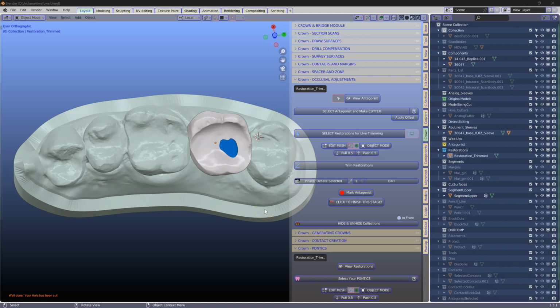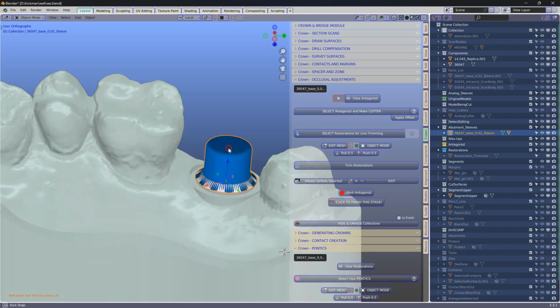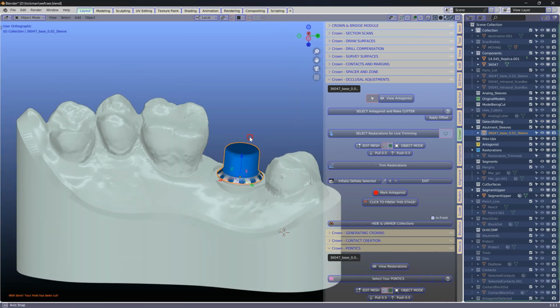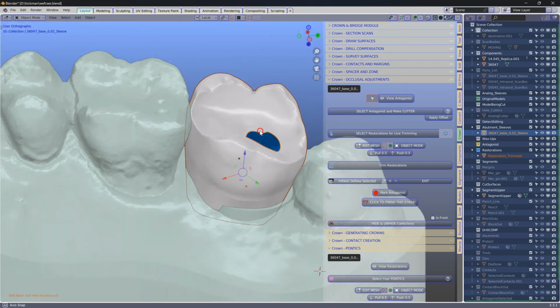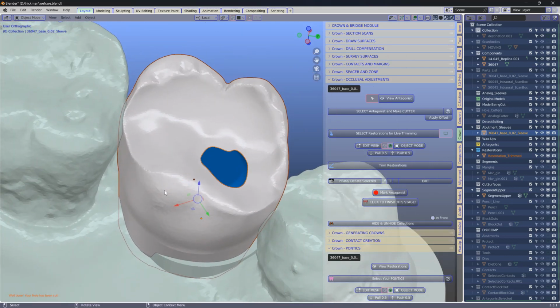Hey guys, clearly we've got a problem over here. Not so much the anatomy of the crown, but we've got an abutment here, and there is no other abutment. There is no shallower abutment. So that's popping right out of our tooth. Now, in the analog world, we would just cut it down. So we'd make a transfer coping and cut it down.